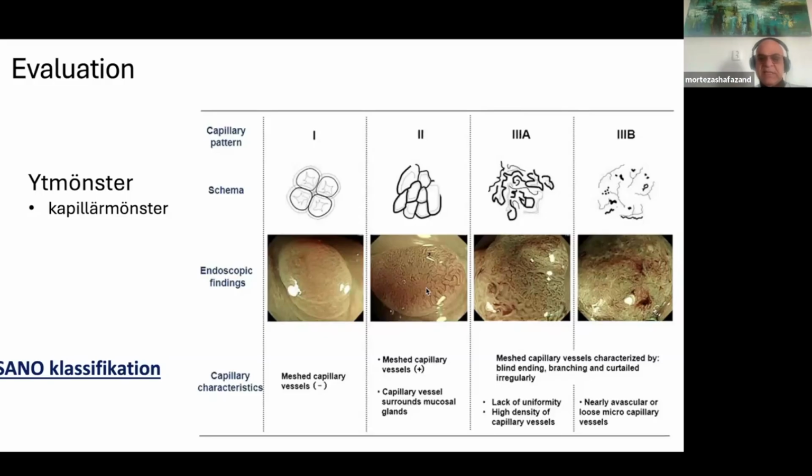If you look at these pictures, for instance, all of these are cancers. But if you don't look at the whole lesion, you just go to this lateral side and look very nicely with NBI close to it, this is low grade dysplasia. But as you said, you have to see the whole entire lesion, see all those eventual signs of cancer, demarcation lines, reddish areas, etc.